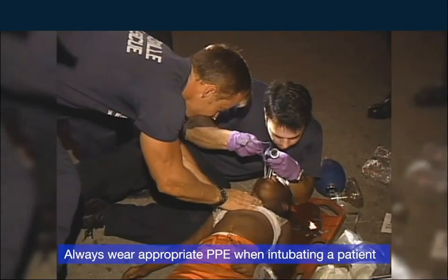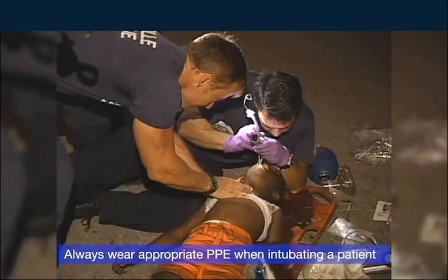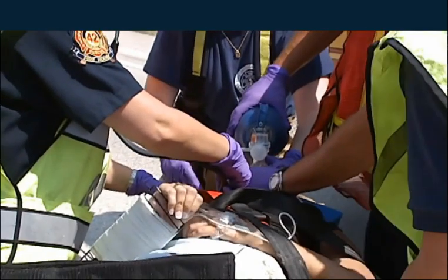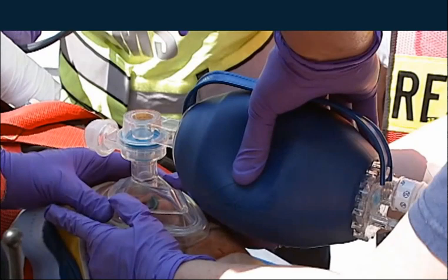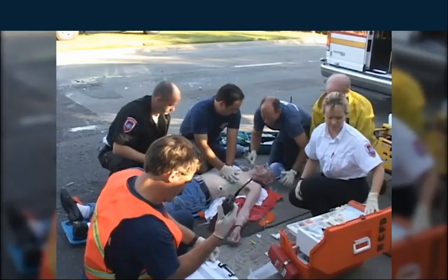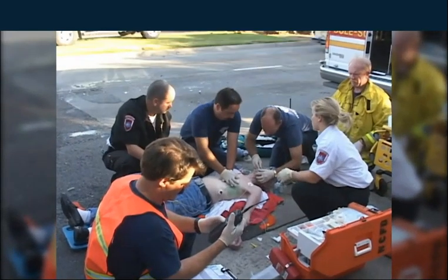Most responders are familiar with using capnography for reliably identifying endotracheal tube placement and rapidly identifying endotracheal tube displacement. However, many responders only intubate 8 to 10 times a year or less, depending on the responder's service area and the number of providers in their EMS system.